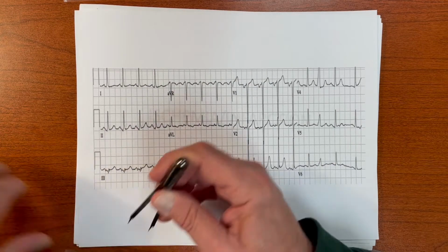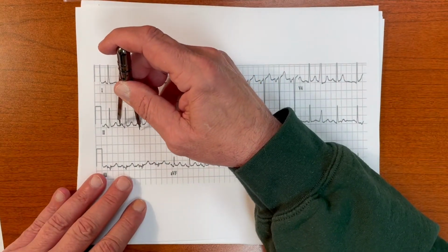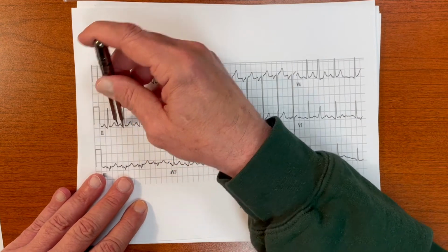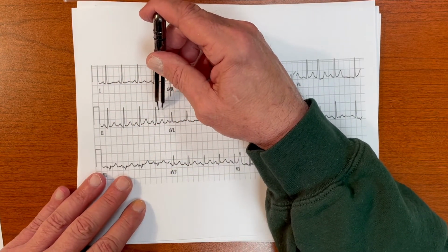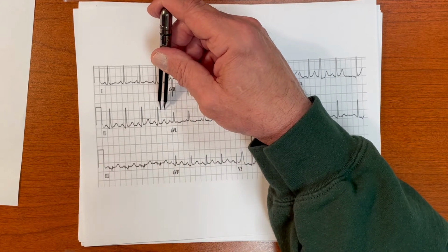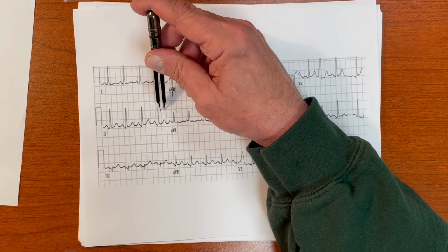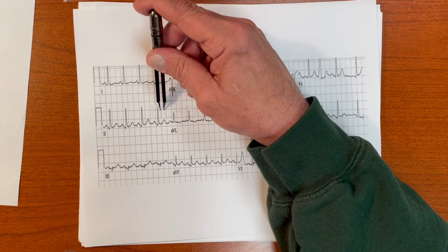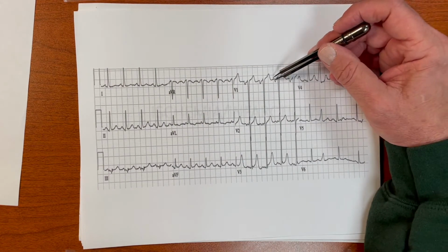And let's see. Okay, and so here we see, for looking at the left atrial enlargement, is it greater than 3 small boxes? It's right at about 3 small boxes wide. But it doesn't matter because you made the diagnosis here, okay?